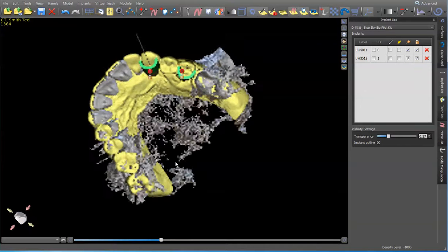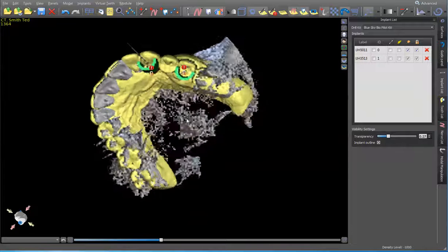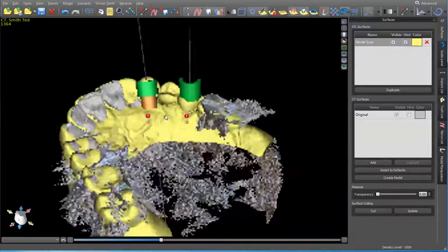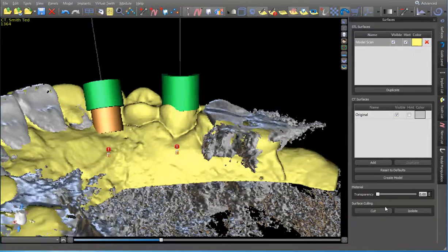So in the surgical guide, when we go to make our surgical guide in this area, I'm going to have to take this model. So go into surfaces, click on model, and I'm going to have to cut these teeth out before I make the guide. So what we'll do is we'll isolate, cut, hold down the shift key, and this tooth's going to be missing too. So I'm going to remove the lateral incisor, the canine, premolar, cut all those out, and we'll double check it.